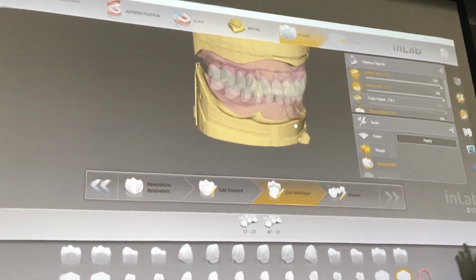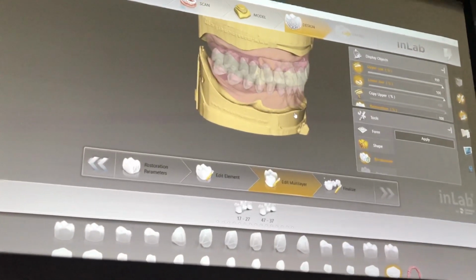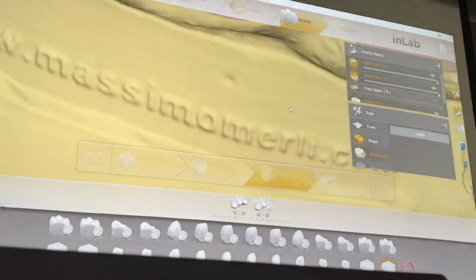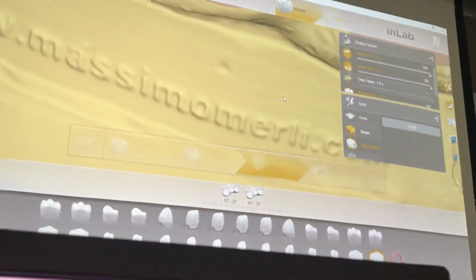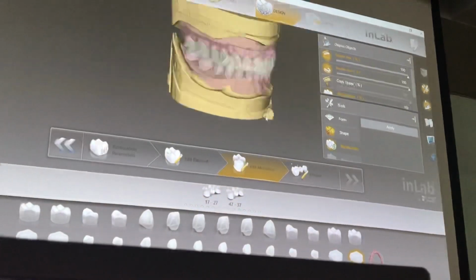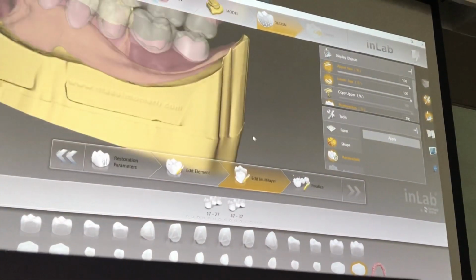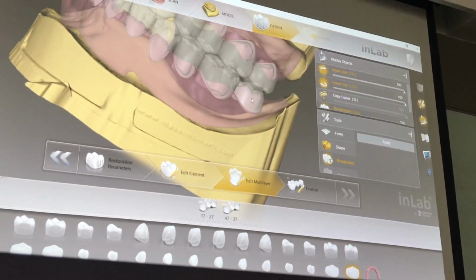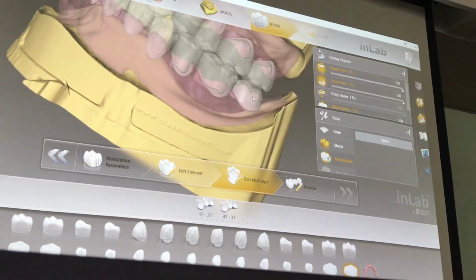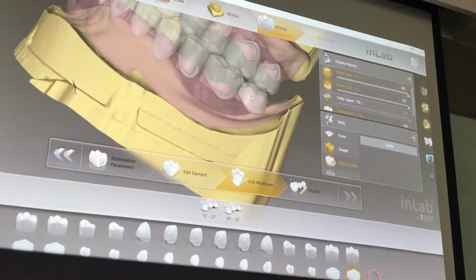It's because we use the scale tool. You know when I showed you on the multi-layers that you could use the scale tool and adjust the height of the preps. And oh, there we go. You see that one, right? So when it does, it gives you the prep like that, right? Yeah. So that will apply to every single one of them. So you'll have preps on all the teeth.